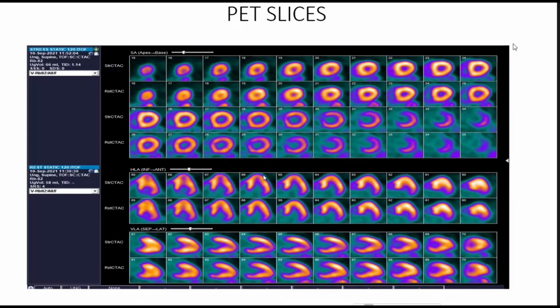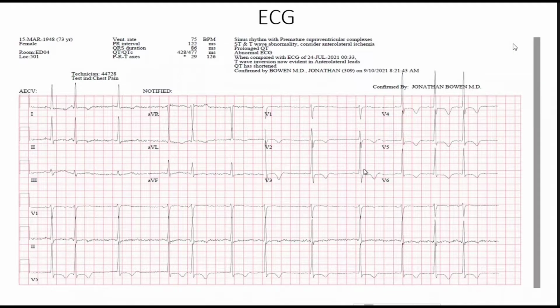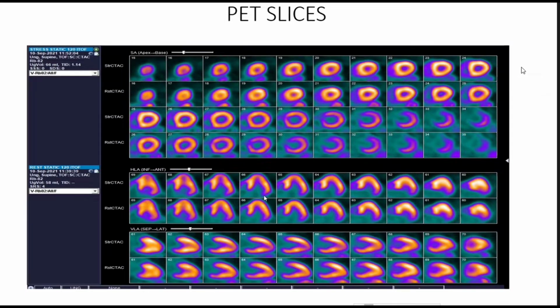Okay, so I guess one other point, sorry, Steve, is in the EKG, Chris had commented on the T wave inversion. Right. And when you think for a second, the distribution here, and then you look at the PET perfusion images, again, if this was an echo, what conclusions might one come to, at least as part of the differential? Very good points. Does anyone want to pick up from what Nishant was saying?